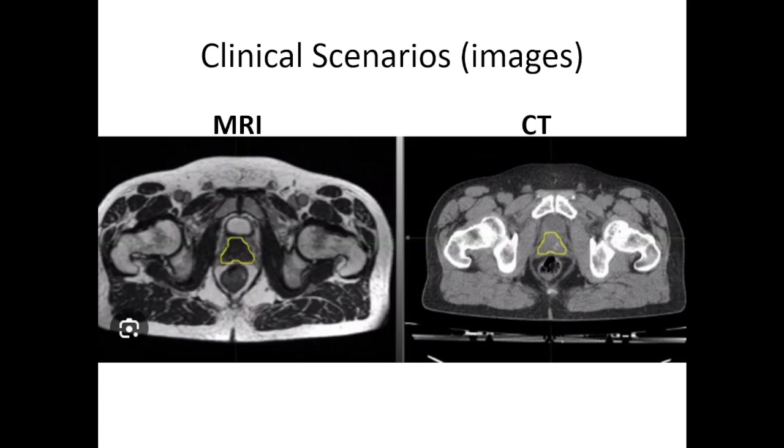However, when we want fast imaging, such as in trauma cases, CT is ideal because you can perform a whole body CT in less than a minute, while MRI will take much longer. And you can see that on MRI, you don't see the bone signals because bone has very few hydrogen components. MRI mainly explores the hydrogen interaction in the magnetic field to extract image contrast.